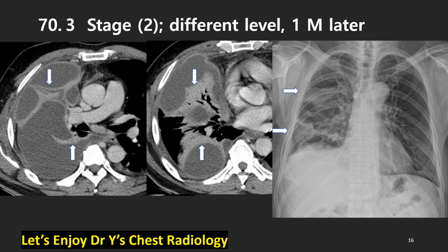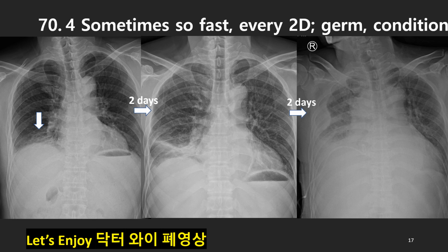On the right side, this chest radiograph shows us what happened 1 month later. Somewhat air fluid level, somewhat loculated, and somewhat ugly looking, not normal looking results. Sometimes the disease progresses so fast, and so we're surprised.